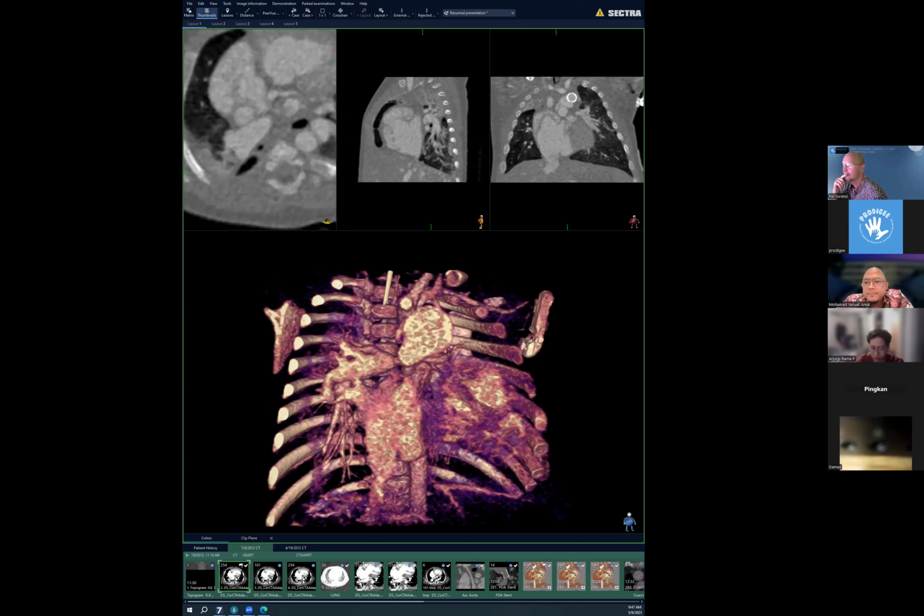We usually use weight-based protocols and hand injection at our institution, but different institutions use different techniques. At our institution, always hand inject, and it's a weight-based dosing, and that's why we have fairly good opacification of both hearts, because it's almost like a venous phase acquisition. And so the preferred injection speed is going to be determined by the physician injecting.